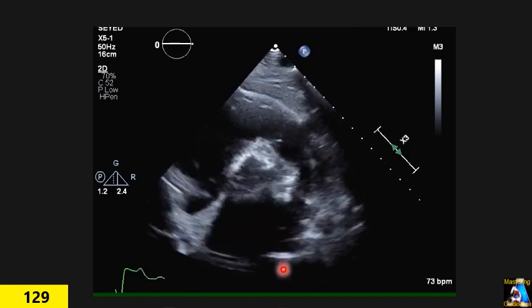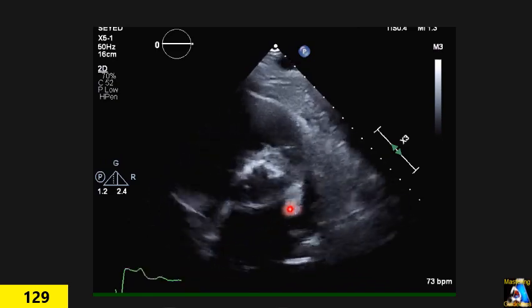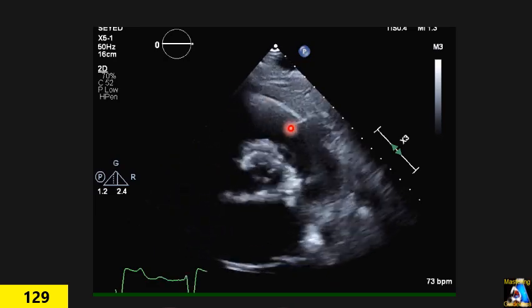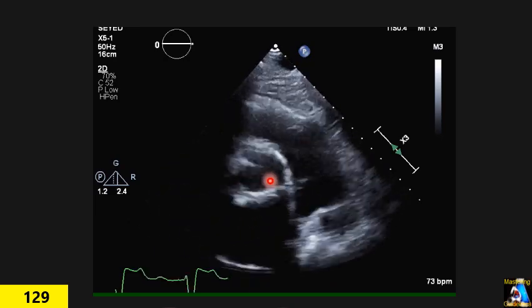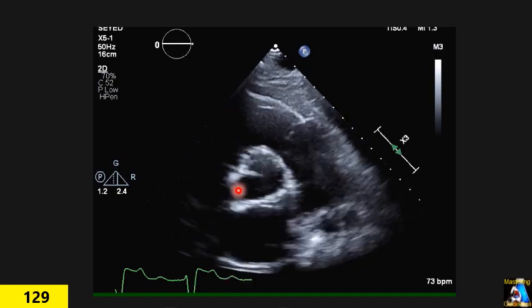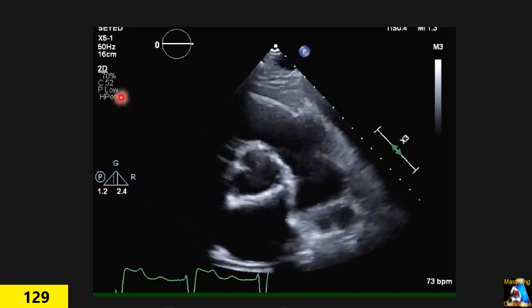And if you can answer this question, what is this wedge shape that shows up at a specific moment here? Give me two findings besides the aortic valve not opening, especially these two cusps, left and non-coronary cusp, which don't open well. What are those findings? And next.